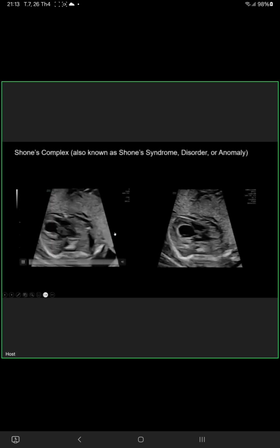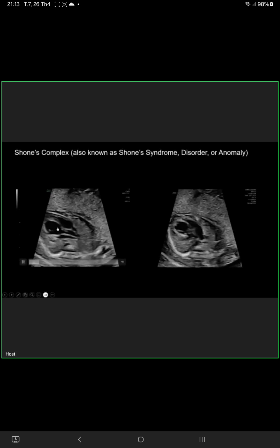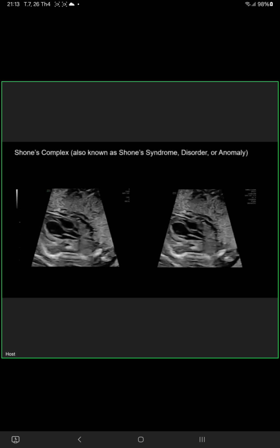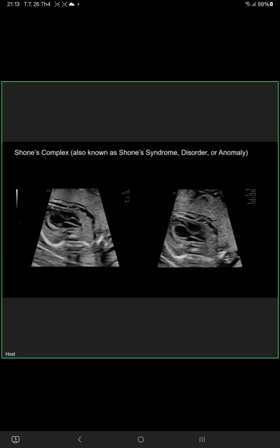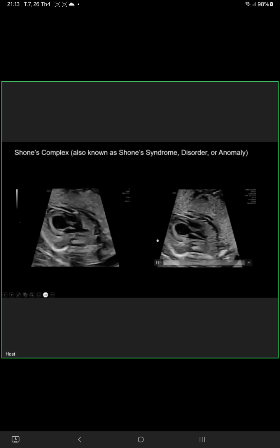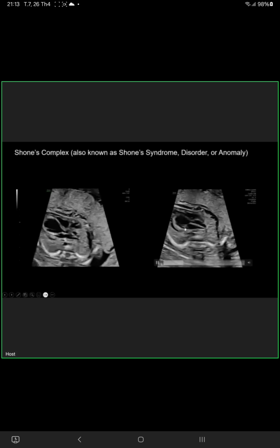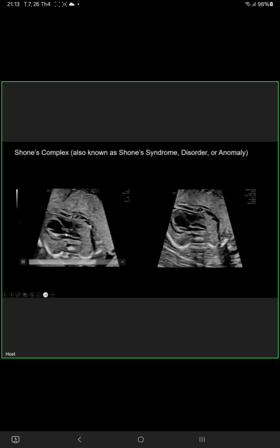What we see here: ballooning dilatation of the left ventricle, high echogenicity of endocardial fibroelastosis, abnormal movements of the muscle of the left ventricle, high echogenicity and a small aortic valve, and abnormal movements of the mitral valve.